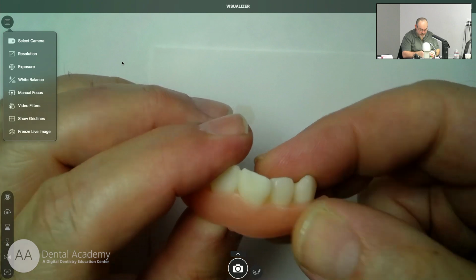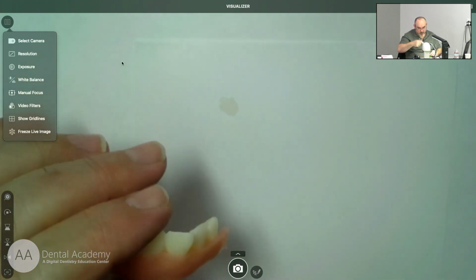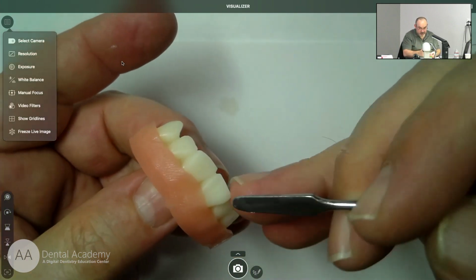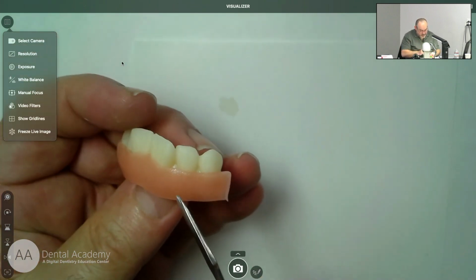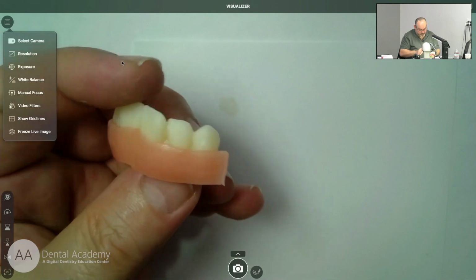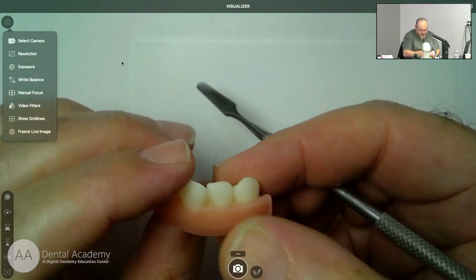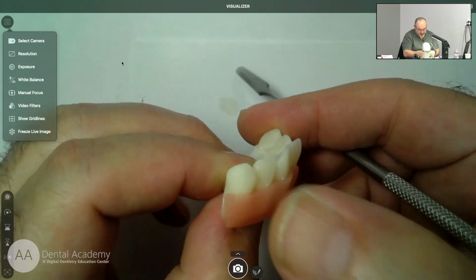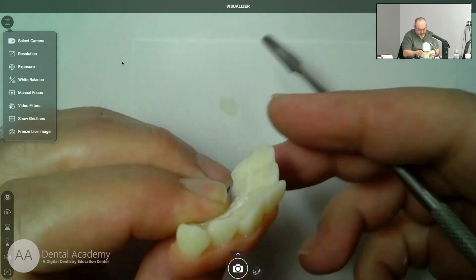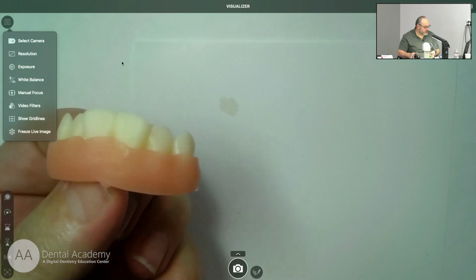Yeah. But you don't want to go overboard. You don't want to go too much because we're going to clean this off. So the more precise you try to keep it at this area, I would say this is the most part that you have to kind of pay attention to what you're doing. So just push it like that. That's all there is to it.